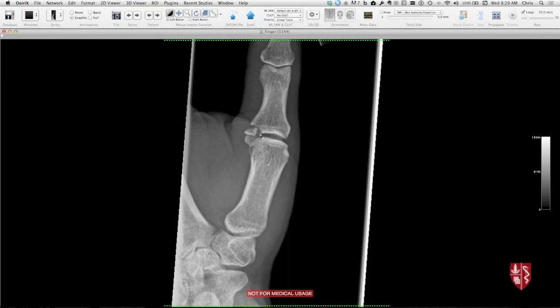Now this one may be subacute, but what's important about this particular injury? Or what's the mechanism that gives you this type of fracture? Breaking the neck of a pigeon. Yes, when you're on your weekends off and you're out in the park and you decide to kill a pigeon. Skiing is a good one. Right. Or a crow or seagull. I guess traditionally it was some sort of game. But skiing, yeah, it's hyperabduction of the thumb or some forcible contraction, and you're tearing, in this case, you have a bony fragment, but it's along the ulnar collateral ligament of the thumb that can avulse off that bony structure there.